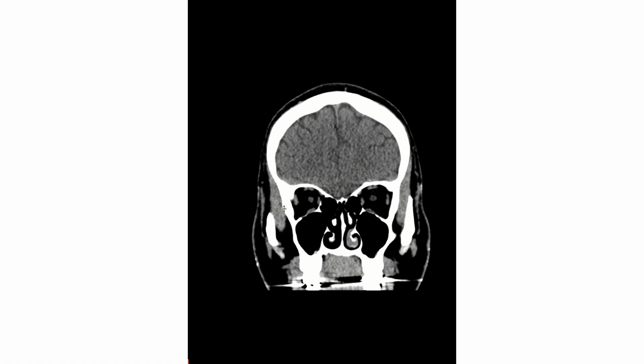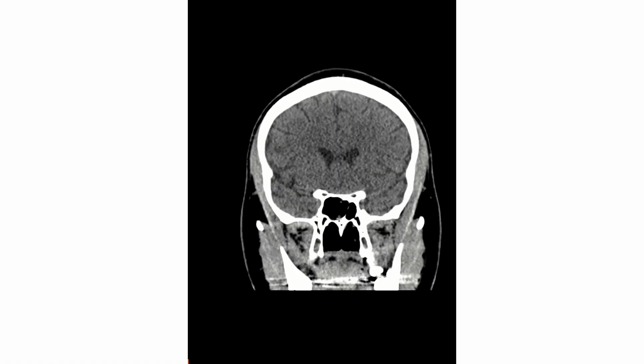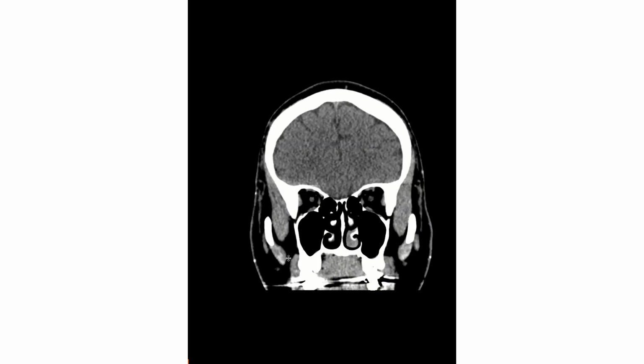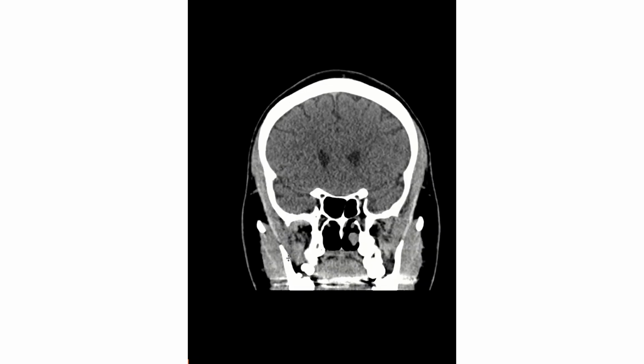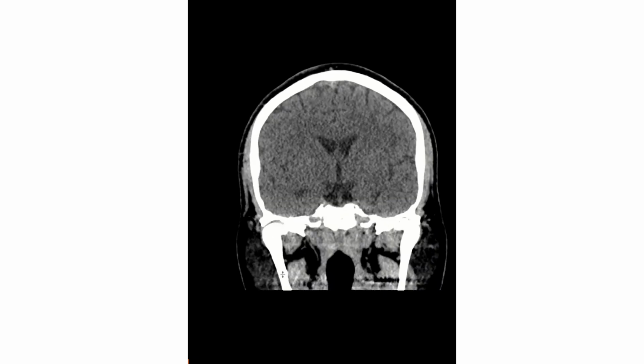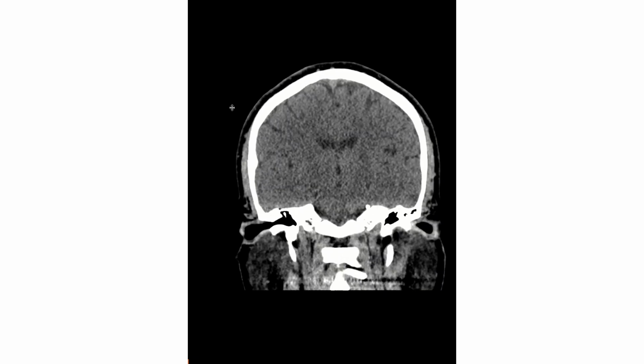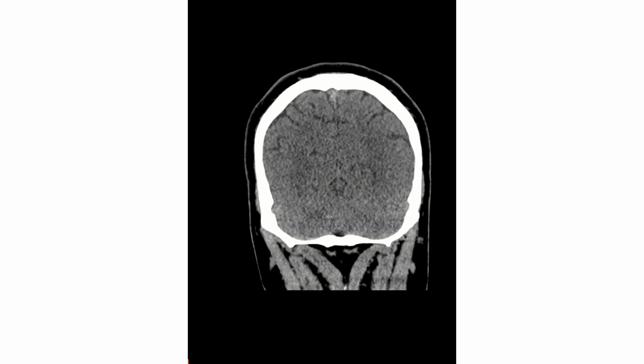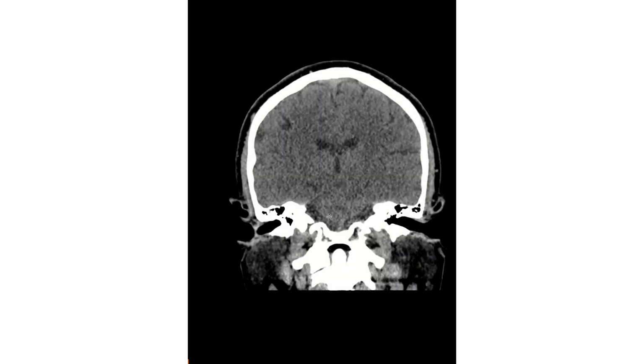You see the optic nerves coming to the orbital apex, and then you have a very nice view of the pituitary gland again, and this is the optic chiasm, pituitary stalk, and then here you have your cavernous sinuses. So again, you look at your soft tissue structures quickly. You make sure that there's nothing in the parotid glands or outside. In trauma cases, you have laceration, you might have large hematomas. So this is another thing that you need to know and pay attention to.